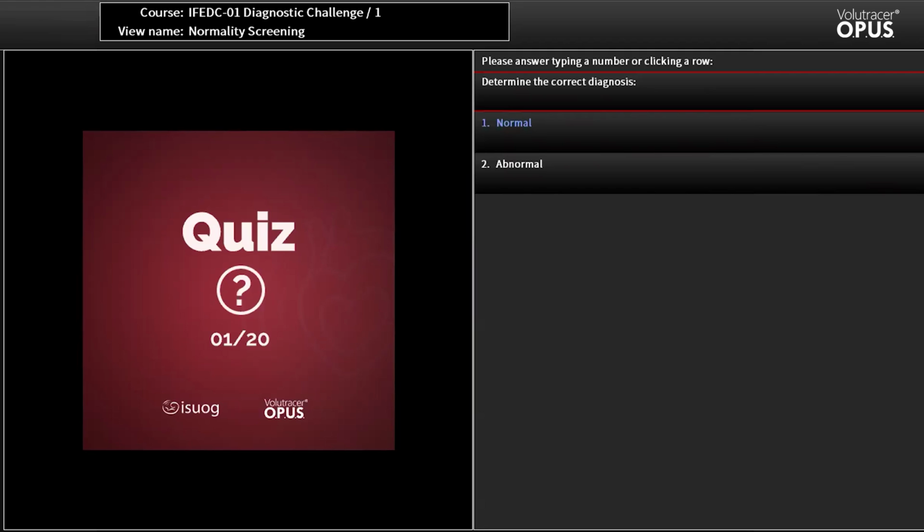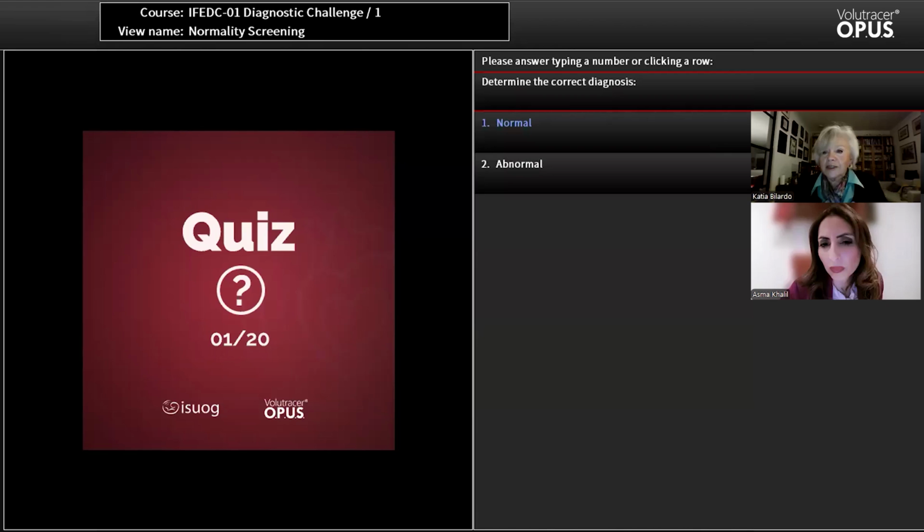And it will drain into the sinus coronarius and through the sinus coronarius reach the right atrium. But because this vessel is not supposed to be there, the sinus coronarius will be dilated. And we will see it as a round structure within the left atrium. In actual fact, it is on the roof of the left atrium.